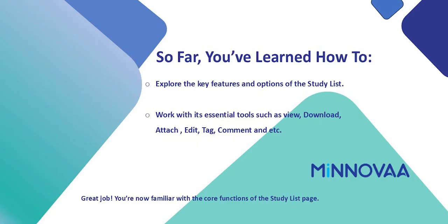So far, you've learned how to explore the key features and options of the study list, work with its essential tools such as view, download, attach, edit, tag, comment, and more. Great job! You're now familiar with the core functions of the study list page.